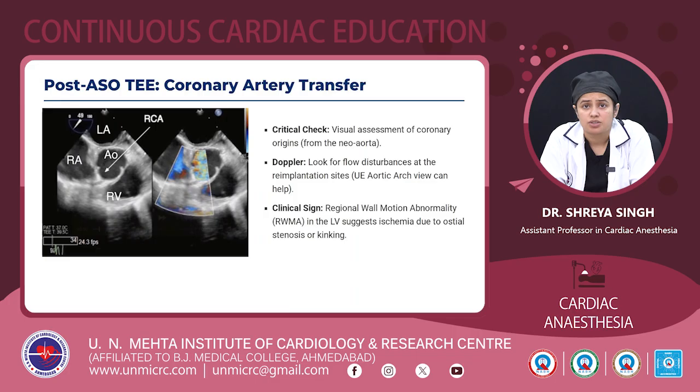Talking about coronary artery transfer. So we need to visualize the coronary origins from the neo-aorta. Look for any flow disturbances at the reimplantation sites. Usually the upper esophageal aortic arch view is used. And any regional wall motion abnormality in the left ventricle suggests ischemia due to ostial stenosis or kinking.